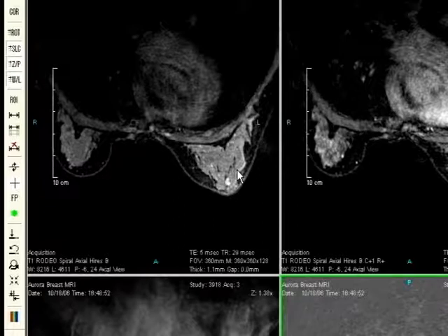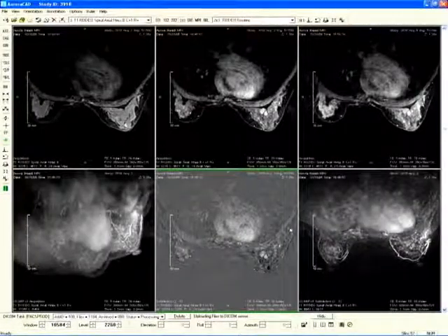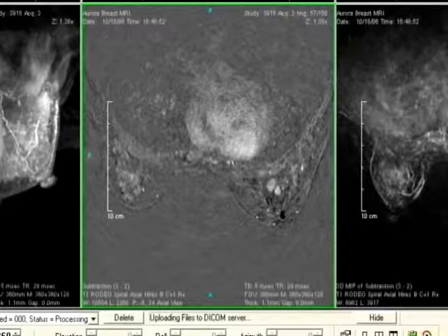The pre-contrast RODEO images are non-spoiled, and long T2 fluids are bright. The post-contrast images are spoiled, rendering the long T2 fluids dark. Unlike most other subtraction displays, AuroraCAD subtractions are able to use both positive and negative scales. Therefore, the AuroraCAD system can distinguish cysts from enhancing lesions on the subtracted images.